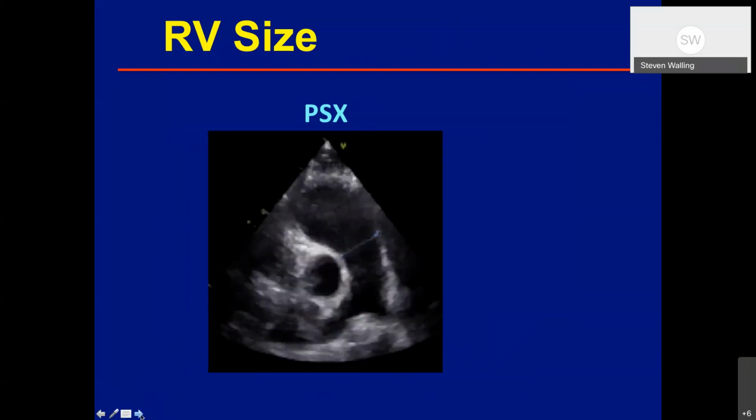Then we go further distal, and you can see here the distal RVOT, where we don't see the pulmonic valve very well. Basically you take the insertion of the base of the pulmonic valve and draw that line. That is the size of the distal one, which is supposed to be around 27 or below. So those are the 3 different sites where we measure the RV outflow.